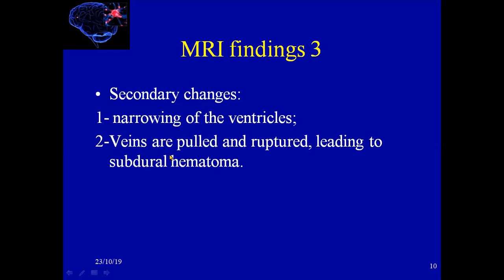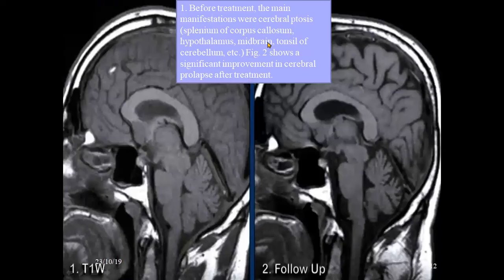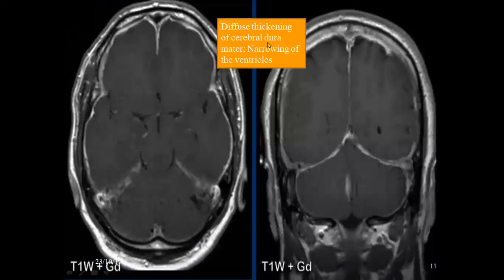Veins will be pulled and ruptured, and you will see subdural hematoma, sometimes hygroma. So here is the diffuse thickening of the cerebral dura mater, and also narrowing of the ventricle system, which cannot be seen on a normal MRI in normal people.